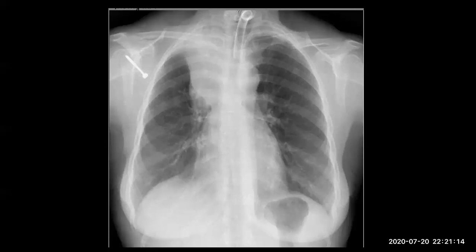PA view. Opacity is seen in the right upper lung. The right lung is small in size, with an elevated right hemidiaphragm, and the right hilum is also elevated. There is endotracheal intubation. The most likely cause, if he is an adult, could be tumor. In children, we should consider foreign body inhalation or mucus plug. These are the differential diagnoses.